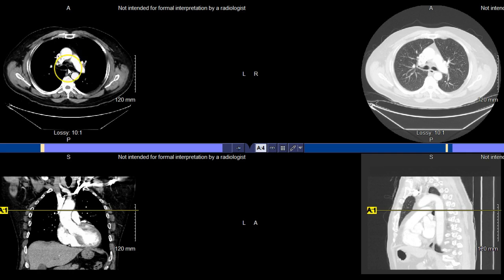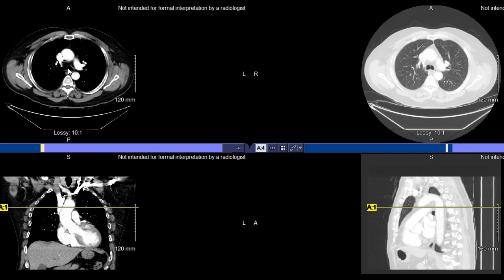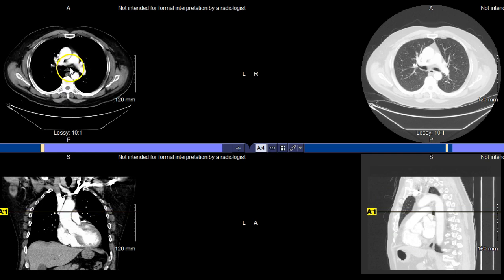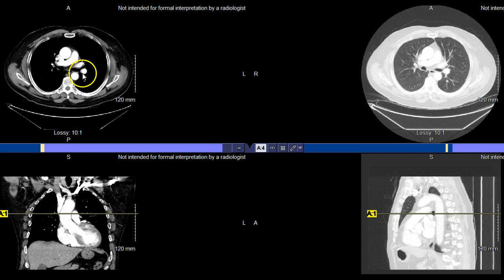So this would be the definition of the point at the carina. So you can see that's true break into those mainstem bronchi there. So it's respectively the right mainstem bronchus versus the left mainstem bronchus. And you can continue out. You can actually see that bifurcation here on the left side as it's dividing out. Then into, you know, the secondary bronchi respectively there and here.